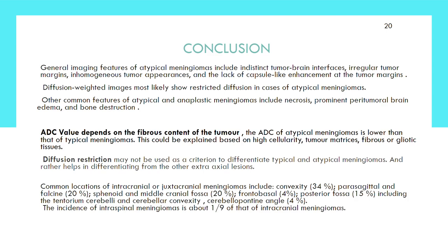Many pathologies affecting the dura can mimic meningiomas. These primarily include neoplastic processes as well as infective and metastatic disease. While distinguishing these on imaging is difficult, there are many characteristic features which may help to point to the diagnosis.